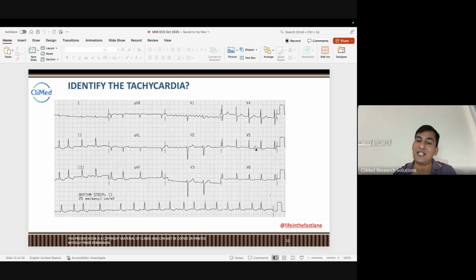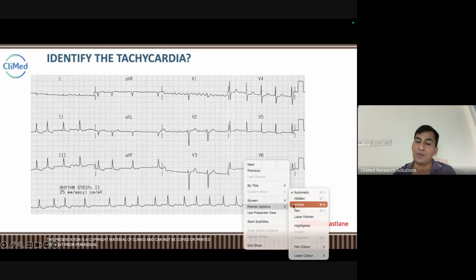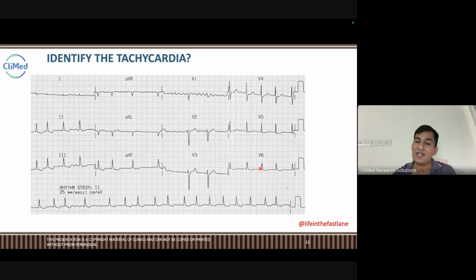Here QRS complex, T, but no P wave. Here QRS complex, T is here, but no P wave. Here QRS complex, little T wave, no P wave. This is the T wave. Here in this QRS complex, T inversion, no P wave. Or here it is flutter, T wave and then two waves, right? It is flutter. Here it is completely flutter. Multiple waves between QRST or RR, multiple waves. This is the flutter form.